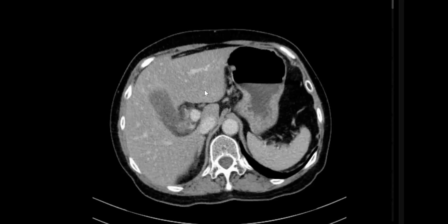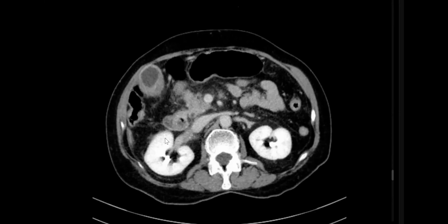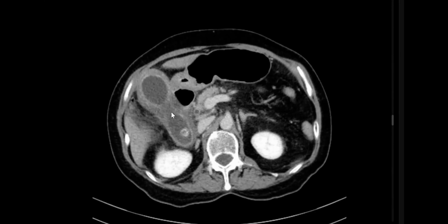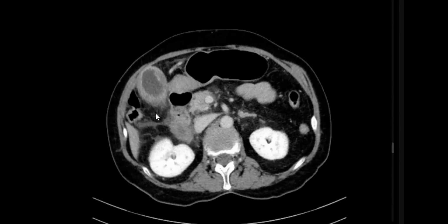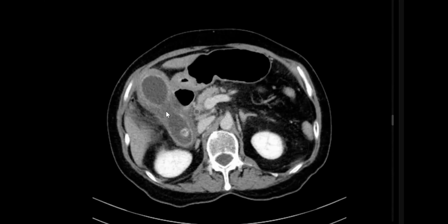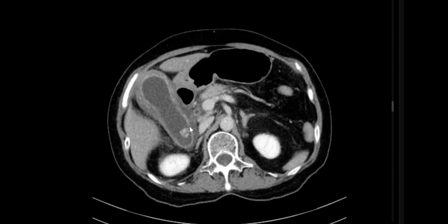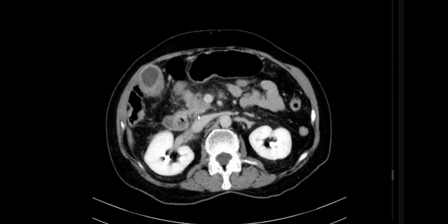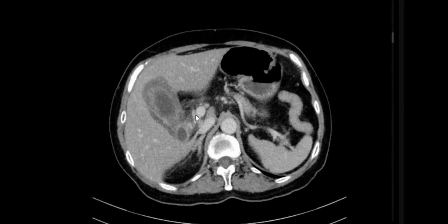This is just an easy case. Give me the diagnosis, just diagnosis. Acute cholecystitis: hyper enhancing, thickened wall, smudging of the fat planes, expanded. This is important, expanded, and we have one or more stones at its neck. Reactive thickening of the CBD can be seen, so reactive cholangitis, it's a mild form.